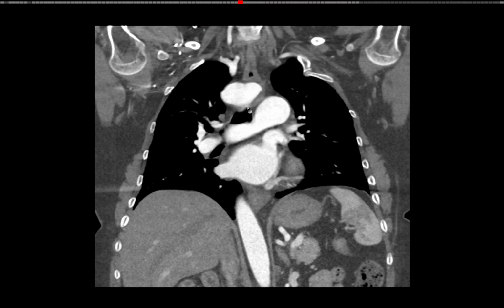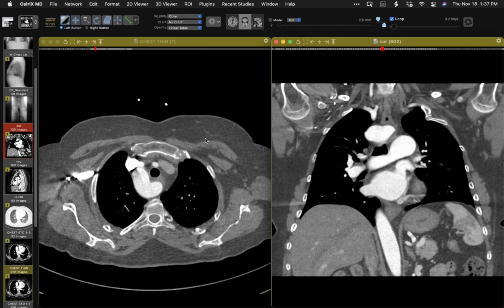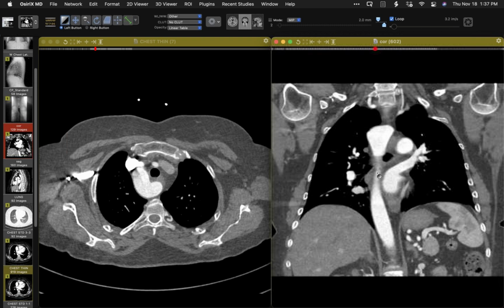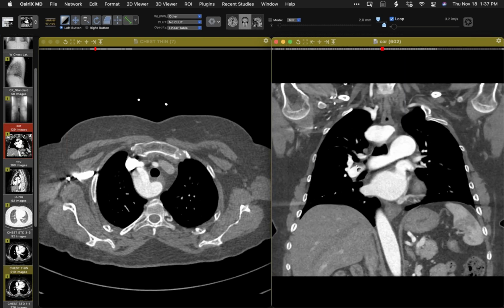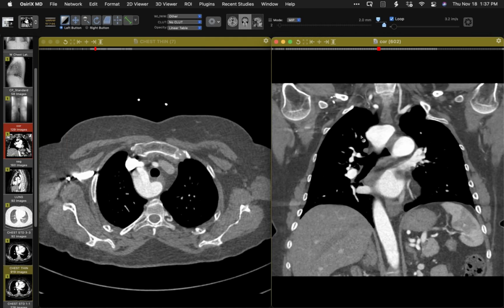If I remember correctly, the original diverticulum of Kommerell from his paper was with an aberrant right subclavian artery, but they decided to operate on this patient. So the findings here are the unusual circumstance of right aortic arch with isolated left subclavian artery.